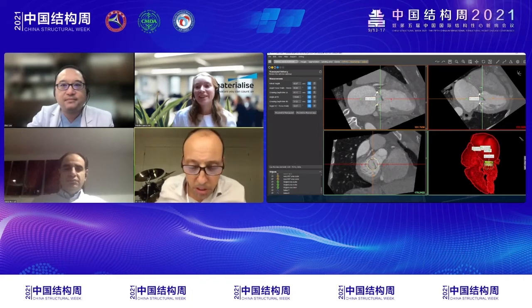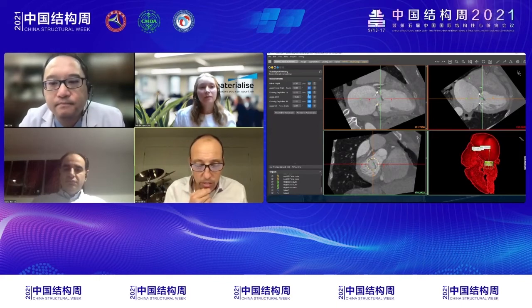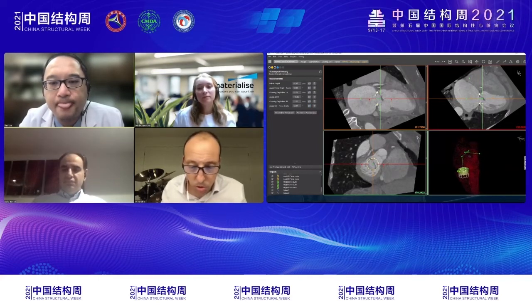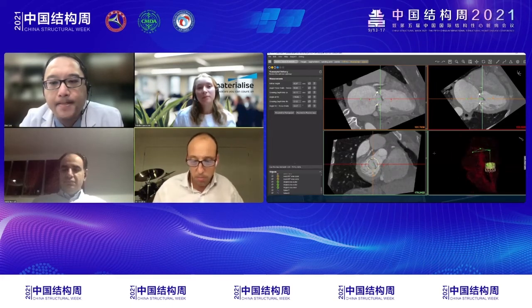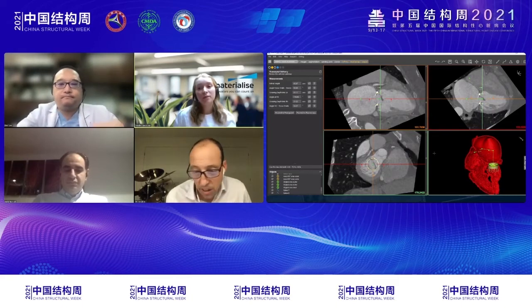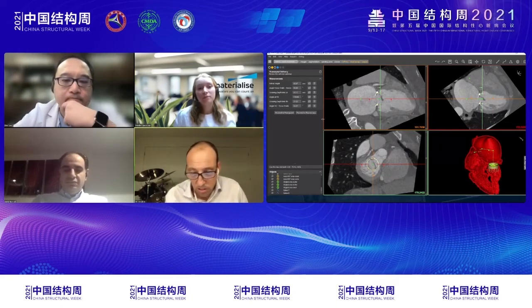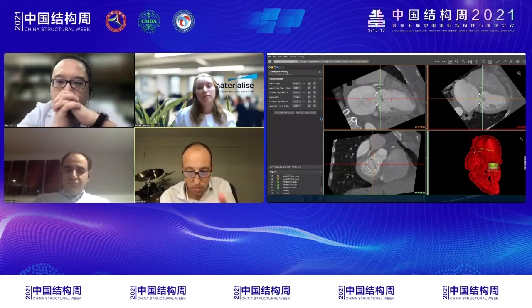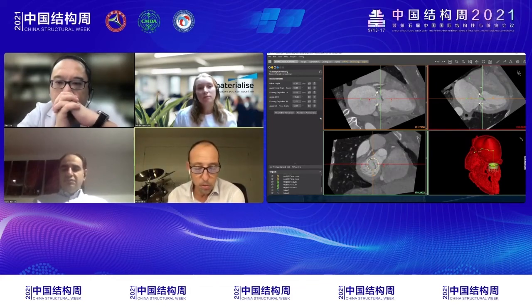I guess you can potentially adjust your transseptal location depending on your case, on what you're doing. So having these kinds of measurements, you can potentially plan your transseptal to reach the mitral valve in a good position for your procedure. Yes, so I see value of that. You can potentially say I will go higher in this case, turn 90 degrees after a few centimeters to reach the valve in a good position to deliver my new valve. Mm-hmm. Okay. Yeah, indeed, that's the goal.